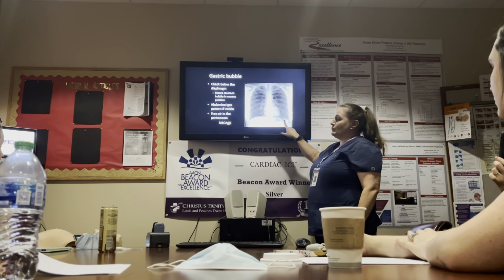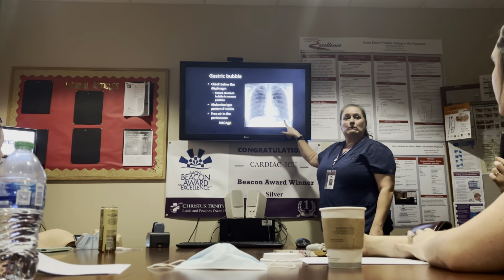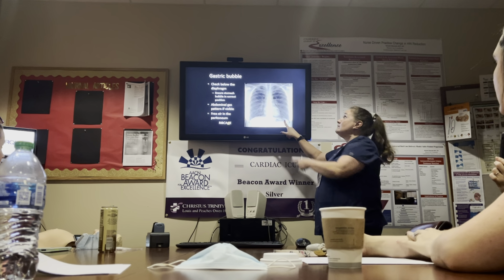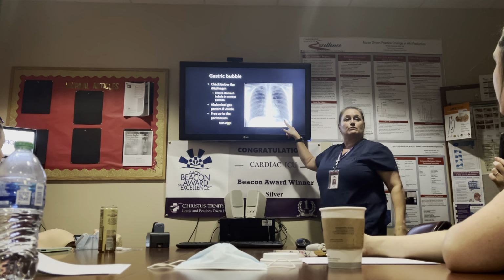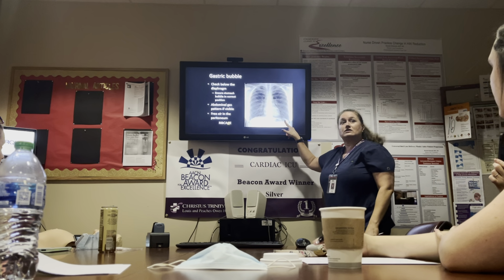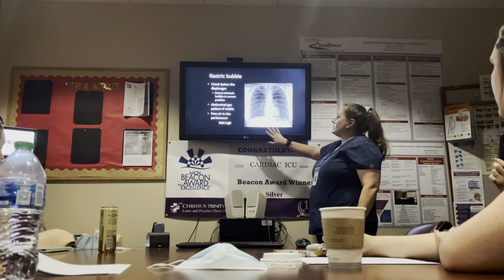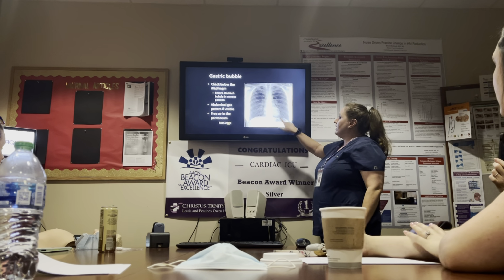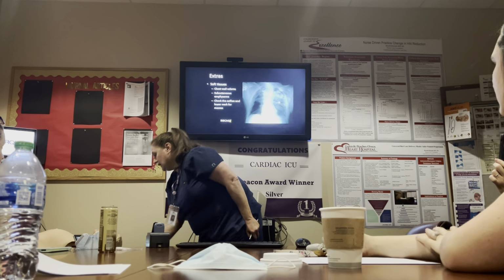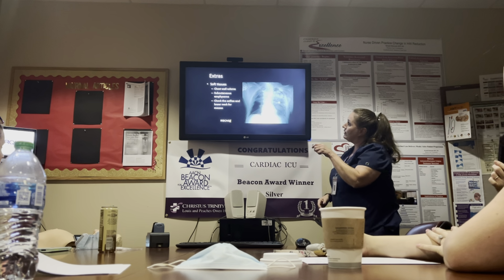So is it in the correct spot? Sometimes you will have patients that have dextrocardia, meaning that their heart is flipped, and sometimes their organs are flipped. Sometimes the film is labeled wrong, so you have to look and see what's going on with the patient and make sure that it's in the right spot and that they labeled it right. Is there abdominal gas down here? Is there free air? Because you can see free air under the diaphragms as well, and I'll show you a picture of that. And then we go to extras. There are a lot of extras in this spot here.